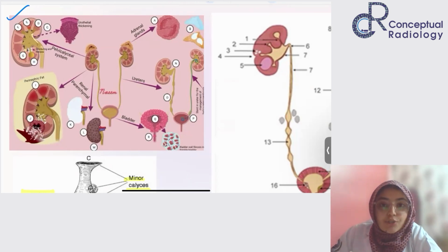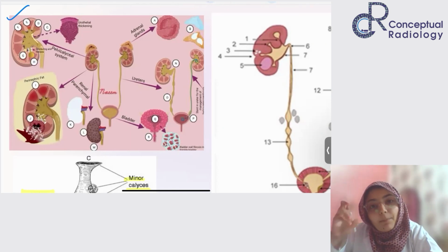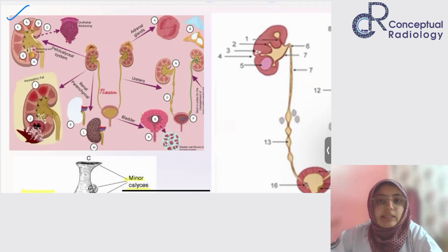Here in the pelvicalyceal system, the disease process is going to involve your fornix, which is part of the minor calyx, and then the infundibulum. We'll come to that. I'm just telling you the names of things. In PCS involvement, the earliest, most benign kind of process when it is just starting will start with the fornix. And it will go on to cause infundibular stenosis. Then it will cause caliectasis, which will be very uneven, irregular, asymmetric. In the late stages, the ureter is also involved, and because of that, there is always a component of hydronephrosis plus or minus hydroureteronephrosis.